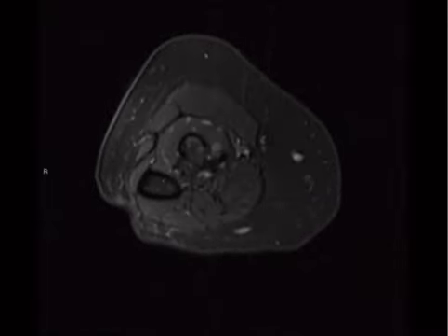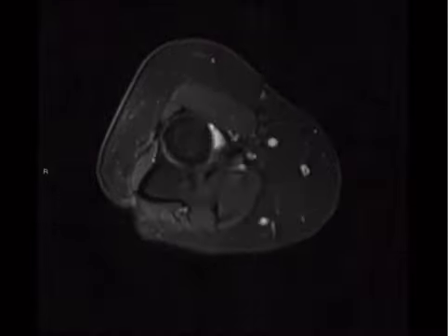All right, here's another. Now we are in an axial plane here, and we're going to do an elbow case, and we're going to scroll down, scroll down, scroll down. Scrolling down. Oh, we're scrolling up, actually. Well, down, depending on your perspective. So this is the thing I want to point out to you, is this right here. Okay, watch that black thing.